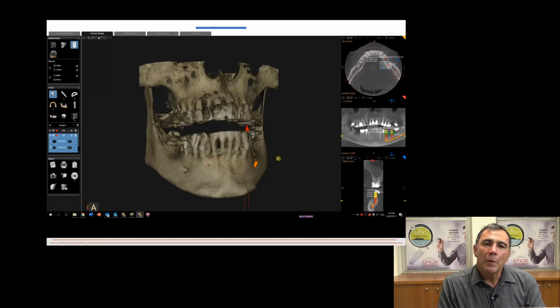And remember, from here I then take all of this information, I send it to the dental technician. The prosthodontist takes a digital scan which we superimpose on each other, and then we start planning and making sure that the implants are prosthetically driven. The only reason for what I've done until now was to see if it is possible for me to communicate with a prosthodontist that implants are a possible treatment option.